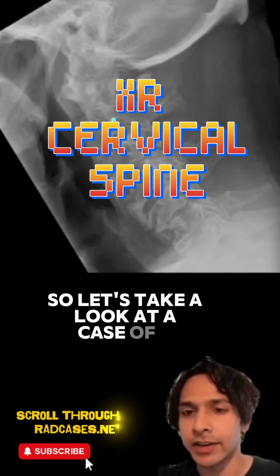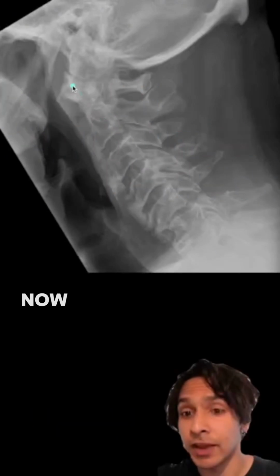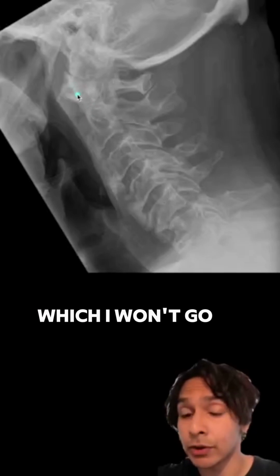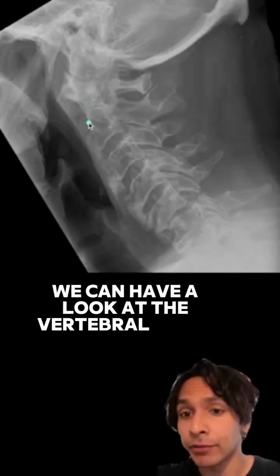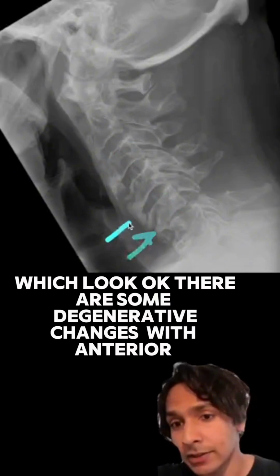So let's take a look at a case of a cervical spine x-ray. So here we've got a lateral view of the cervical spine. Now it's important to have a checklist with these, which I won't go into too much detail, but we can have a look at the vertebral body heights first of all, which look okay. There's some degenerative changes with anterior osteophytes.